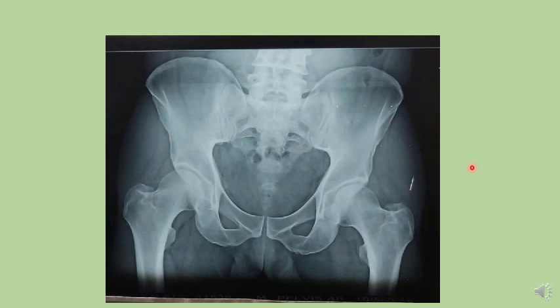This is radiograph of pelvis. How to read this radiograph? This is plain radiograph of pelvis, AP view. You need not mention the side here because one mistake in this radiograph is they have to mention the side, whether this is right or which is left. Only one side they have to mention for clinical application of this investigation. So maybe I have cropped it.